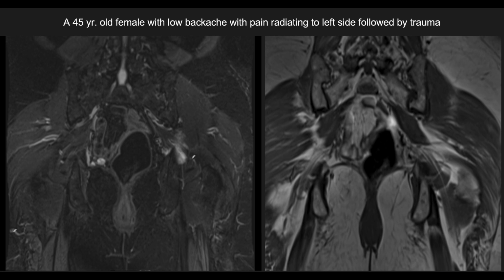Let's discuss an interesting case of a 45-year-old female patient presented with low back pain radiating to the left side, followed by a trauma. Lumbar spine examination, hip joint examination and sacroiliac joint examination revealed no significant abnormality except for mild widening of the sacroiliac joint space and reduction.